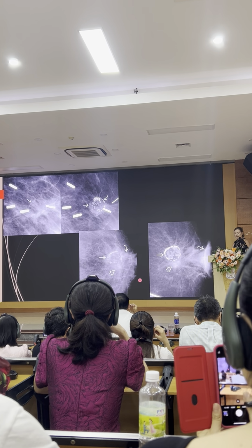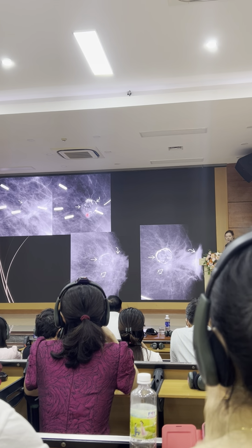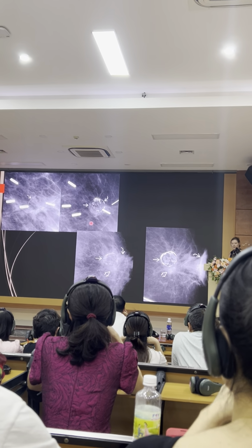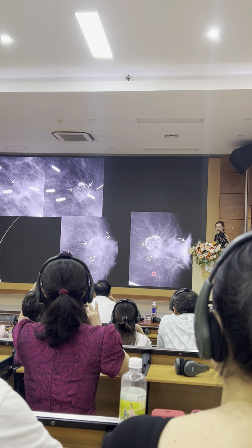This is another outcome of fat necrosis. So this patient had a wide local excision. This is just an oil cyst and how the calcification developed peripherally over time. Very benign appearance. This is a different case of fat necrosis, whereas this patient actually developed local recurrence at the margin of the fat necrosis. So just be aware to look carefully if you do see fat necrosis and there's a history of a wide local excision, because you can get a recurrence. This one actually had some nipple retraction involved.